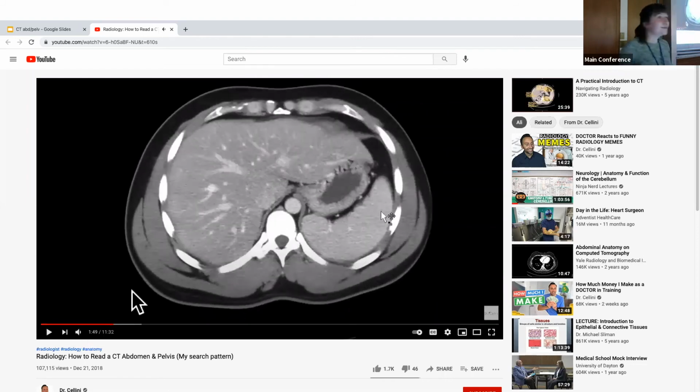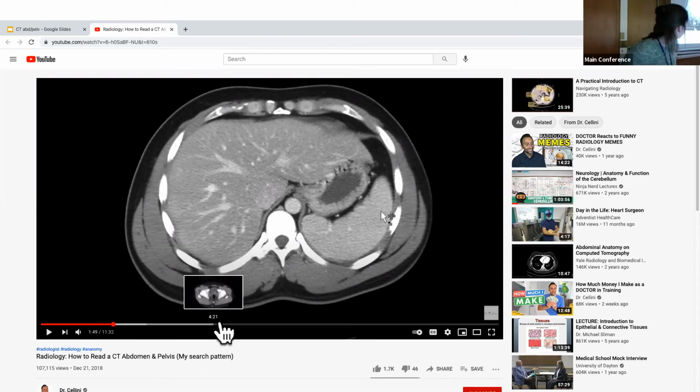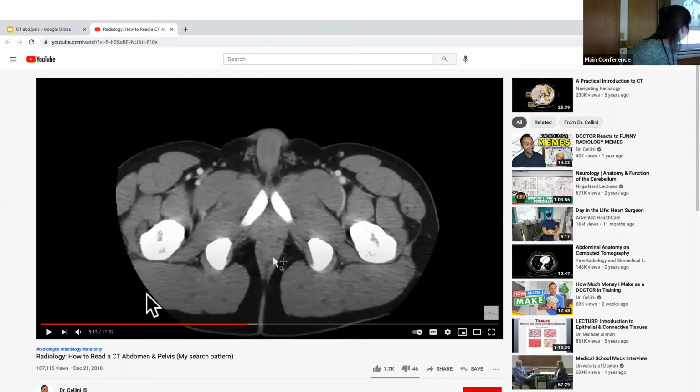Okay. So if you can see, you have to do a lot of scrolling back and forth because things are going to take different twists and dives. And then we'll go a little further. Large bowel is a little more exciting to watch.